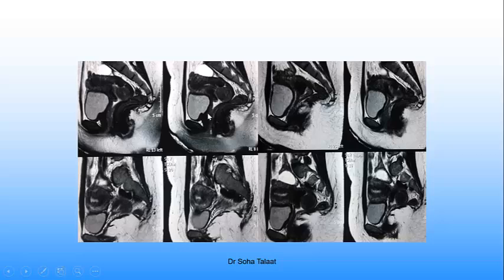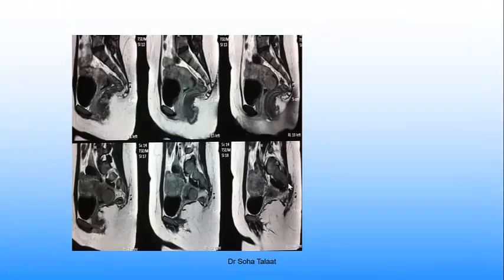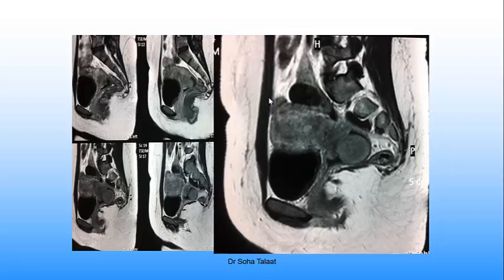This is a fibroid. Also, the patient accidentally has adenomyosis, and usually adenomyosis and endometriosis are associated with fibroid lesions, and she has a cyst in the ovary also here. But this is the signal intensity of a prolapsed fibroid. It takes the same enhancement as the myometrium, so this is a pedunculated prolapsed fibroid.